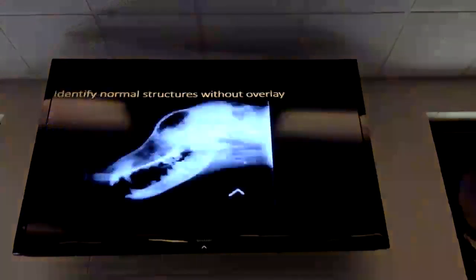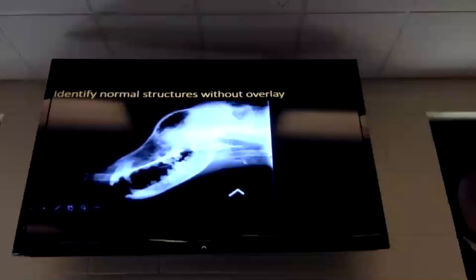This is just for review, so I'm not going to go over this again. This is for your practice. Feline skull, everything stays the same. It's more congested with smaller structures as compared to the dog later, because now we are focusing more on the nasal cavity. Okay.